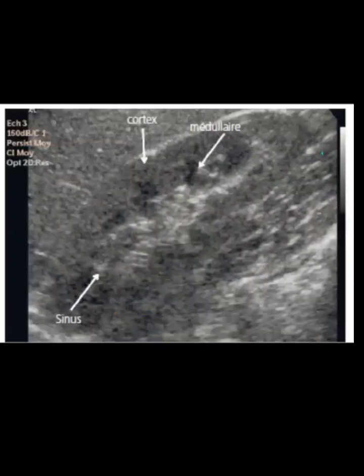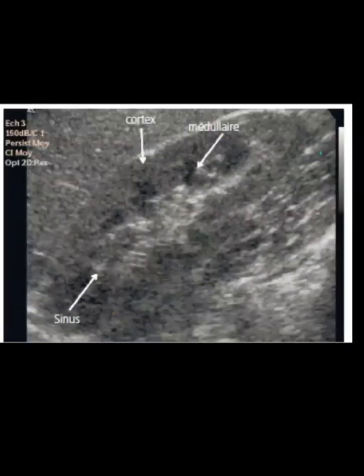What are you seeing here? A 58-year-old hypertensive patient, creatinine of 5.2 milligram per deciliter, long history of hypertension, HB of 8, and no significant proteinuria. Here is grade 4 echogenicity and the corticomedullary distinction has faded off. So it is a picture of a CKD kidney. And if you measure the kidney size, it should be.